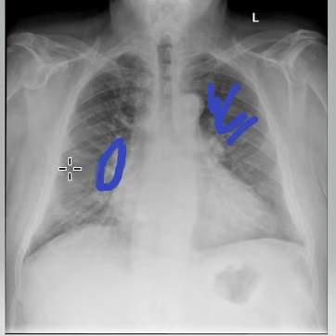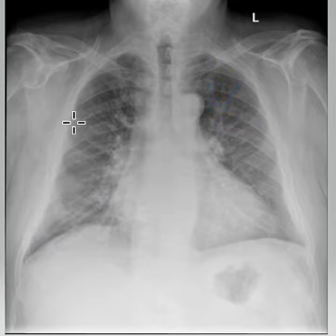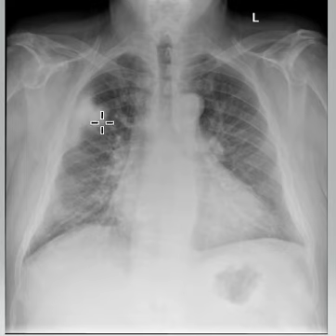And then you have another finding. As I said, you can see these clouds occurring in the lungs. So you can see this cloudy thing. Now if I were to make some clouds here in the lung on my own, you would see what a close resemblance it's making to this cloud over here, this cloudy part. You can't quite see through it.